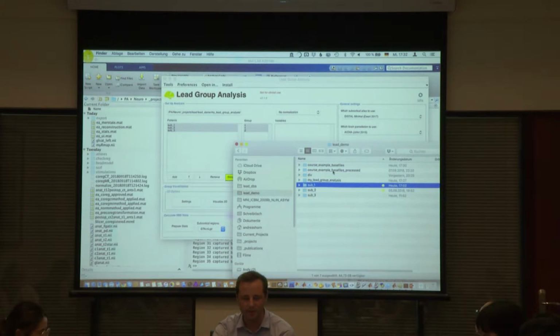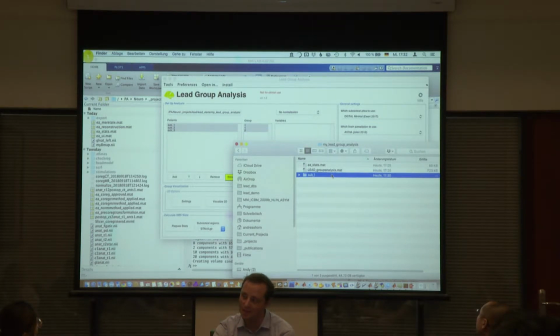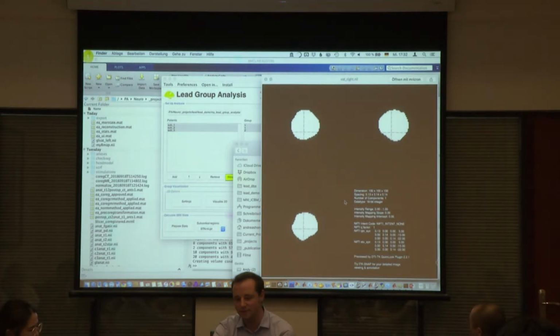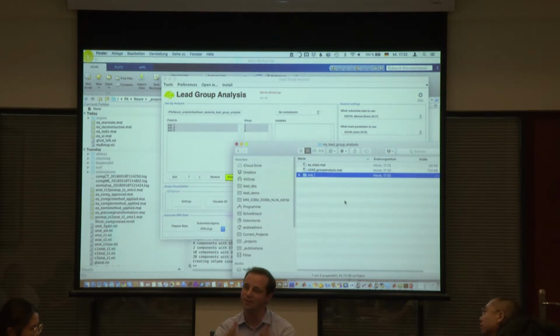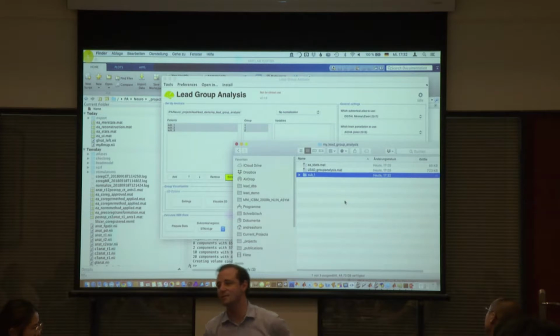Oh no, okay, sorry. So we detach the data. Remember, we pressed this detach button. So that's why Lead Group now doesn't use the patient folder, but inside of the group analysis creates a small folder with the subject one. In here, it's actually our new stimulation. Also has the date of today, so it makes more sense, 2018. And here it already created the right VTA, right? So it will now have all the files that we need inside of this folder, and don't touch the original analysis.